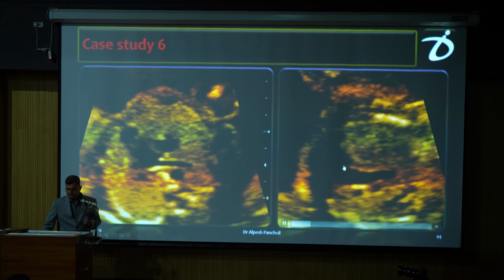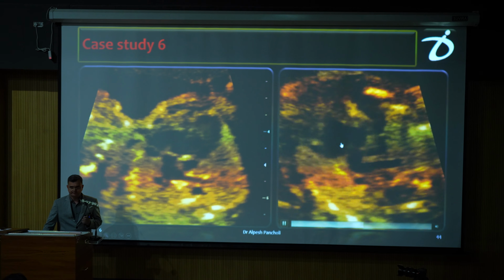And there is a pulmonary artery also arising from the right ventricle. How do we differentiate it from the CAT? Because we see 2 different semilunar valves, aorta and pulmonary, side by side. And here the pulmonary artery is on the left side and there is a large subpulmonic VSD.